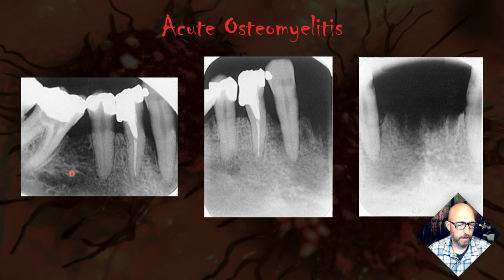This one is somewhat irregular. So in a lot of cases, you will lump something with an irregular border along with a malignant diagnosis, particularly when it's a radiolucency like this. And so I see some signs of malignancy, other signs I don't see. I'm going to focus a lot on the PDL spaces and see how the PDL spaces are intact and uniform, maybe a little bit widened here, but uniform PDL widening.